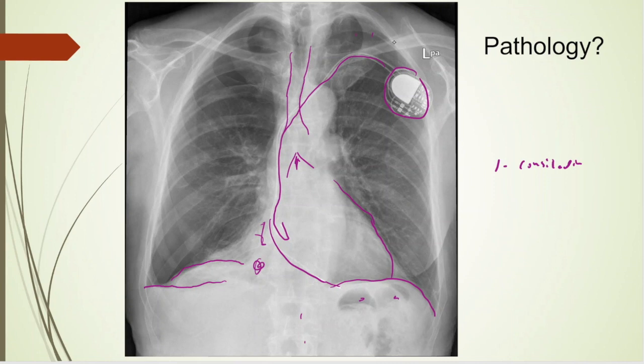And you can see the lung markings go all the way out. This is breast tissue. Lung markings go all the way out, so that's good. And the patient's right side, though, you can see lung markings out here. We already talked about this fluid that we found, that effusion.